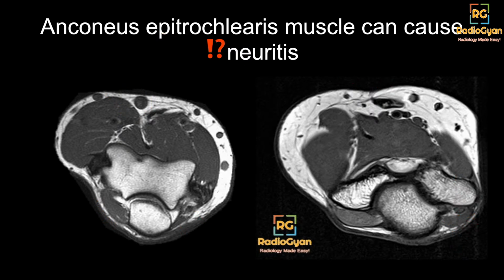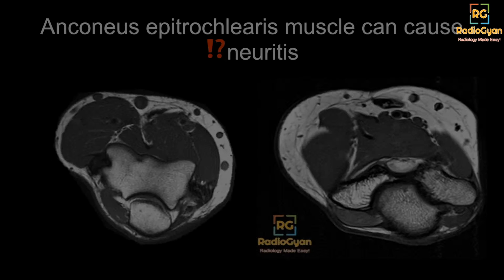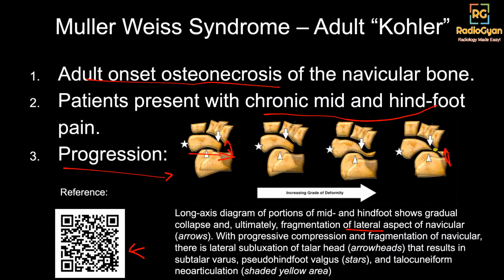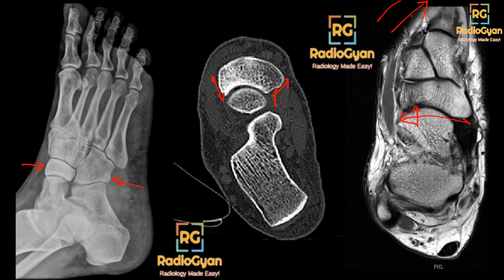And before we move on to the next case, I just want to confirm the laterality. I'm not sure what I said on my image. Yeah, so this is an inverted CT image, so that's causing the confusion, at least for me. So it starts on the lateral aspect and moves on to the medial aspect. If I said medial before, my apologies for that.